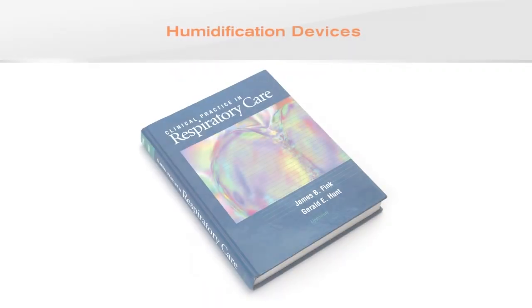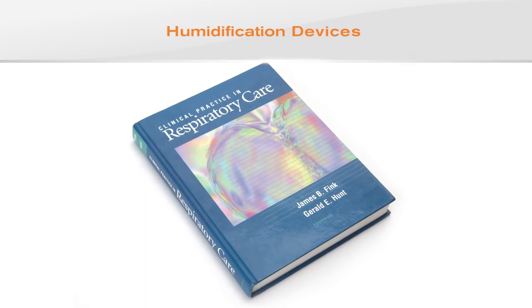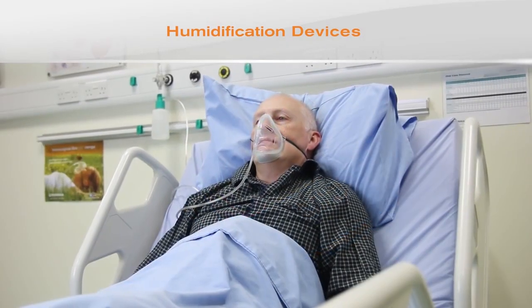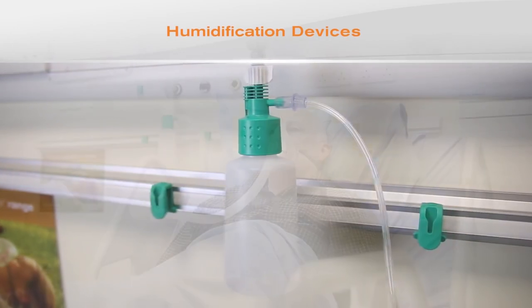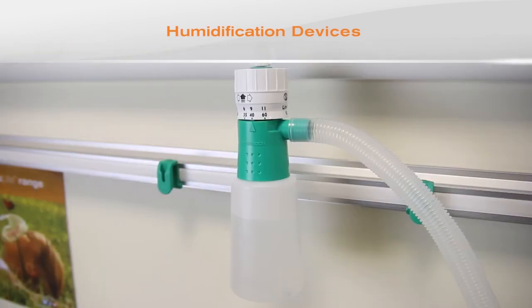Fink and Hunt, in Clinical Practice in Respiratory Care, describe the two most commonly used devices in this category as follows. A humidifier is a device that adds molecular water to gas, whereas a nebulizer produces an aerosol or suspension of particles in gas.